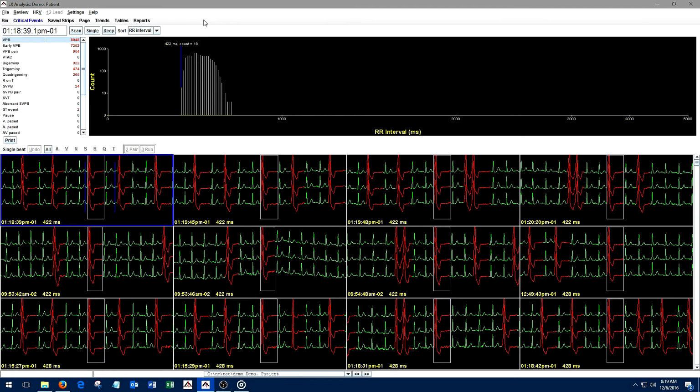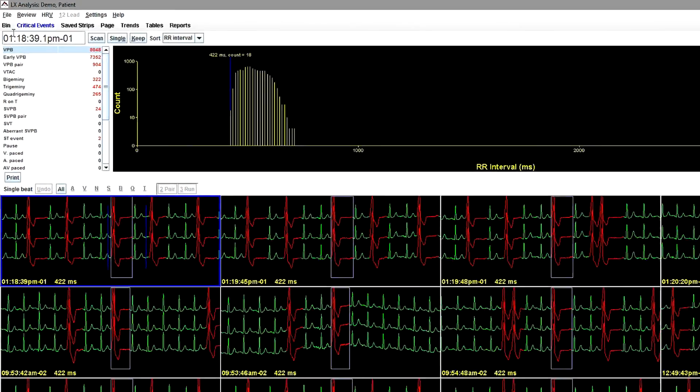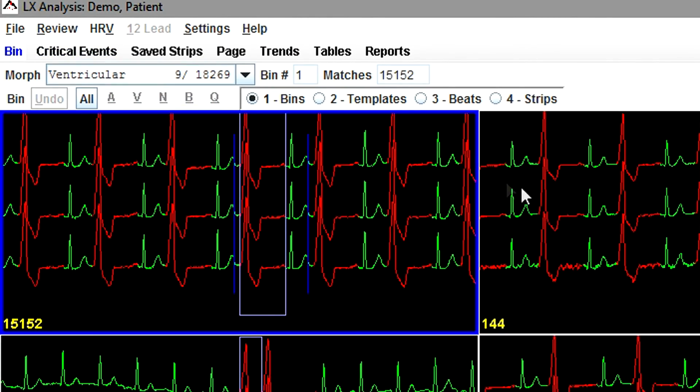Let's now discuss the various review methods that you could use. The Holter signal saved for a patient can be reviewed on the monitor of your computer in several ways. You could review and edit 1. The templates established during analysis.